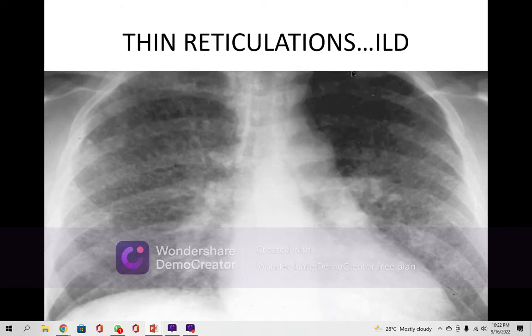The reticulations are thin. In this same case you will see very thin reticulations here. They are not bronchovascular markings, because their angles are not proportionally perpendicular to each other; they arise here and here elsewhere. There is no direction. They are not coming from the hila. Bronchovascular markings should arise from the hila, every bronchovascular marking. Here the reticulation can start elsewhere because this is fibrosis, septa.